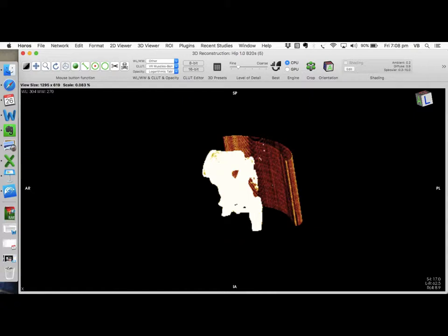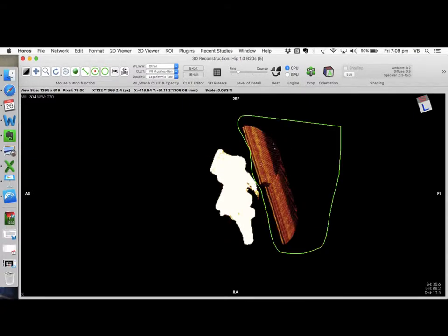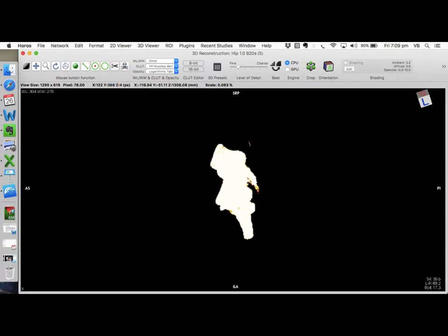Of this we use the scissor shaped tool, and we encircle or identify the area that we don't want and delete it. So slowly we go around deleting these areas. You can see that this scissor tool is highlighted with a magnifying glass. Once we click it, this whole area goes away.